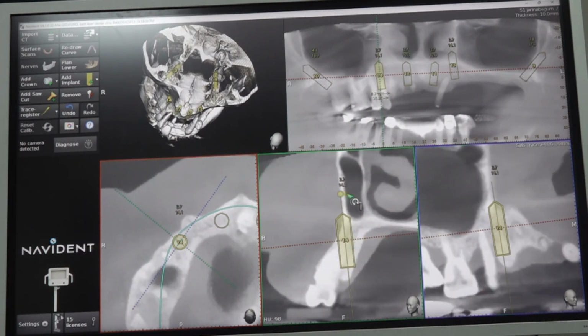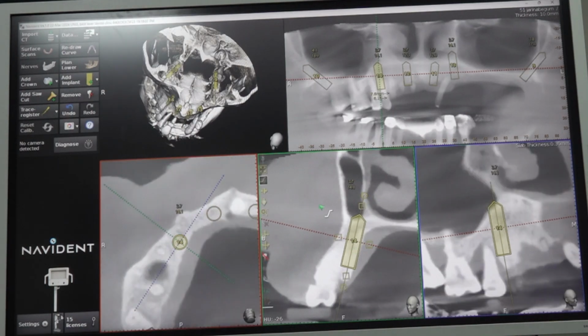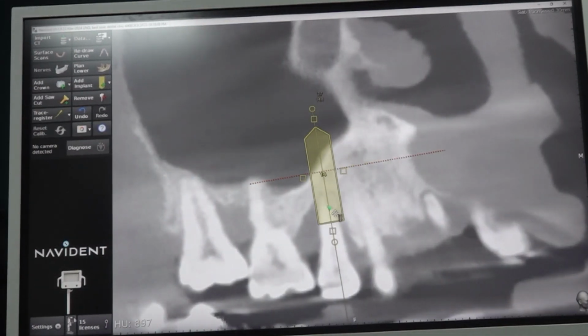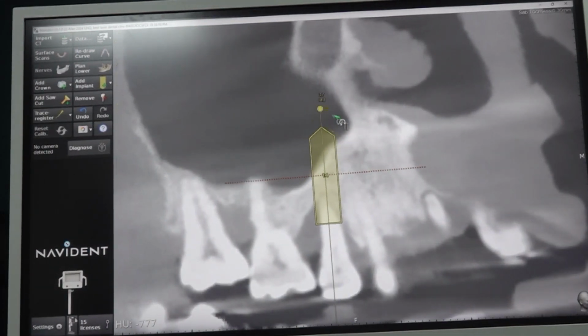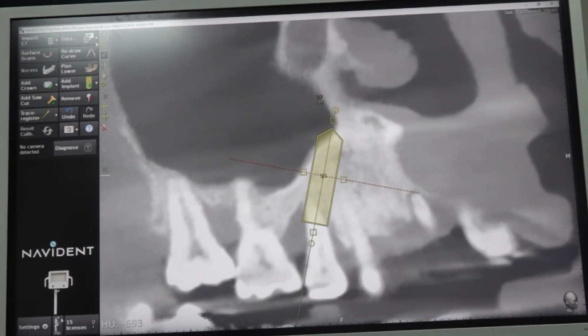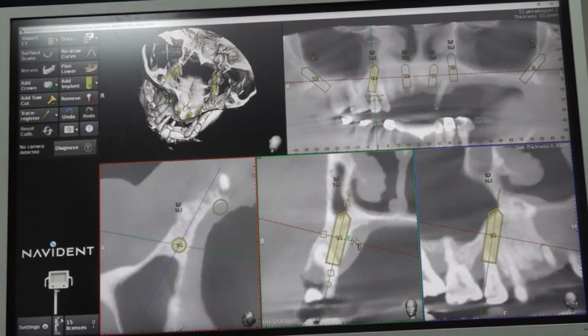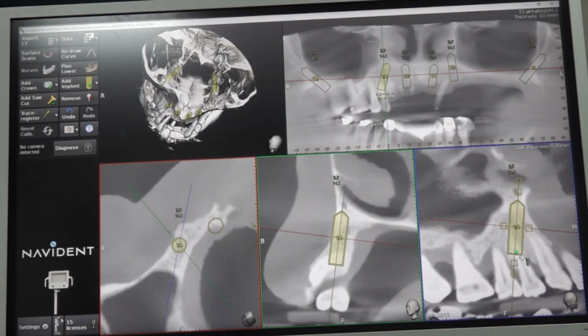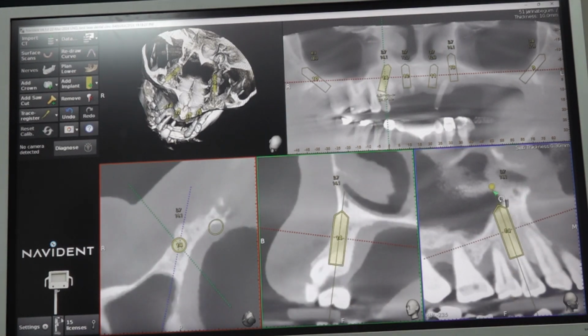And here the sinus comes, right? Okay. So from 5 it is not at all favorable, right? From 5 if you tilt also, it's not good. There is a lot of bone loss in 5. Crestally there is a lot of bone loss in 5, so we are avoiding 5 and we are at 4, right?